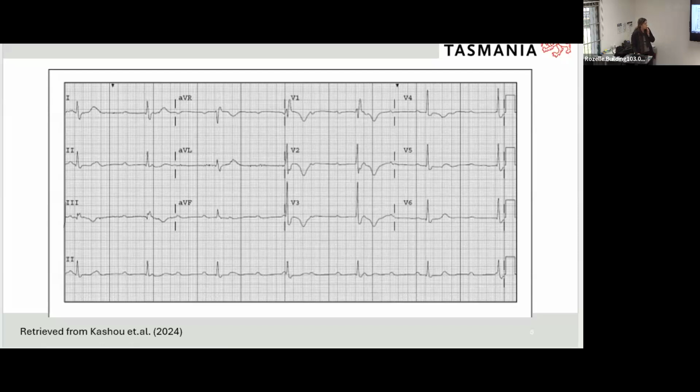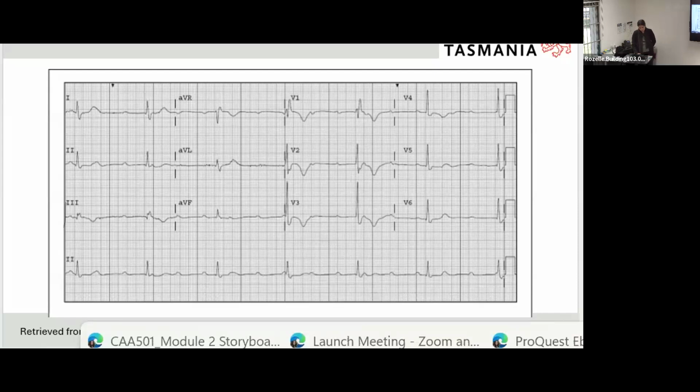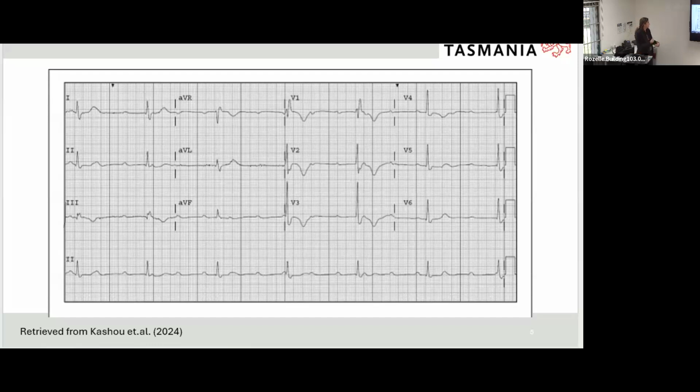Lead 1, 2 and AVF, absolutely, Jack. And what are you looking for in lead 1, 2 and AVF? So which lead should we see our most positive? Yeah, cool. All positive equals normal axis. Yes. Although we have a slight negative deflection in lead 1, but that's potentially normal as well because it's mostly positive, but yes.